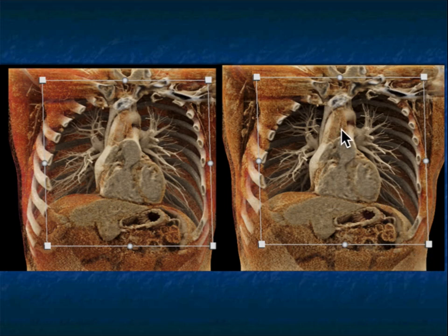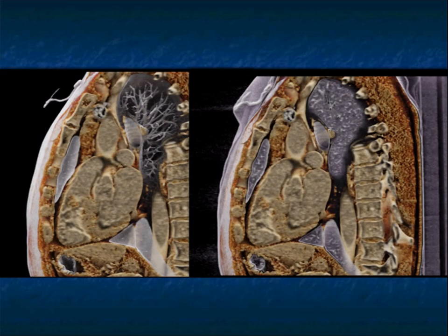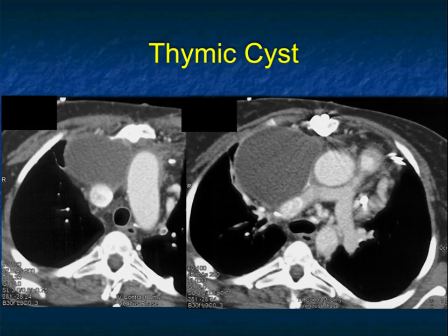On cinematic, here is the thymus sitting right here. And I just love this view, which really shows you the trabeculation of the thymus gland, the enfolding of the lung, beautiful positioning in the anterior mediastinum, showed very nicely also on the sagittal views.